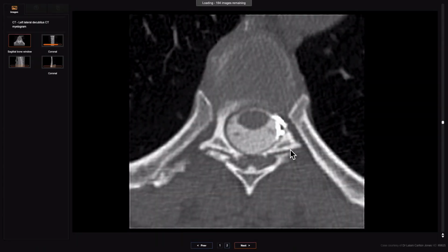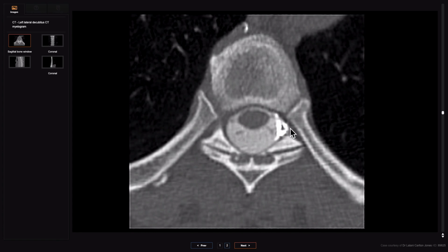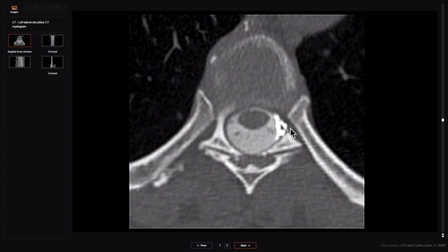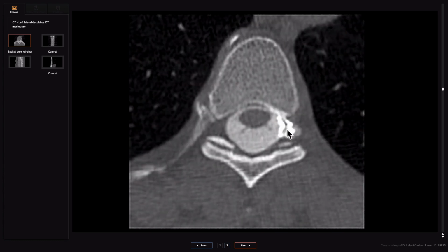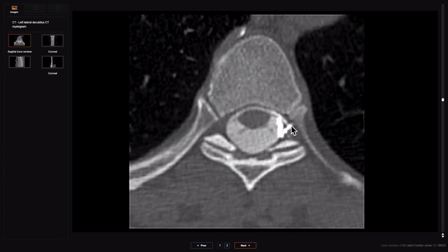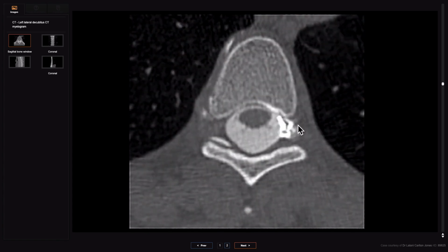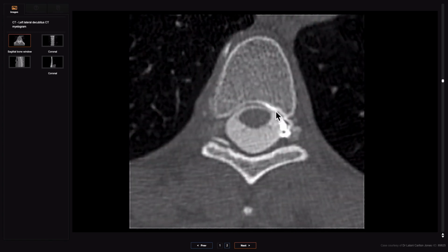So we did an MRI spine and we couldn't see a SLEC, so we were suspicious of a CSF venous fistula, so we went straight for lateral decubitus CTM. And you can see here the layering of contrast on the left side. And what you can see here is that it is in fact opacifying a little diverticulum on this left side at the T5 level, but there are all these little abnormal squiggles that are arising anteriorly around that diverticulum. And look where they head. They head into that anterior epidural space, so suggestive they're in the anterior epidural venous plexus.